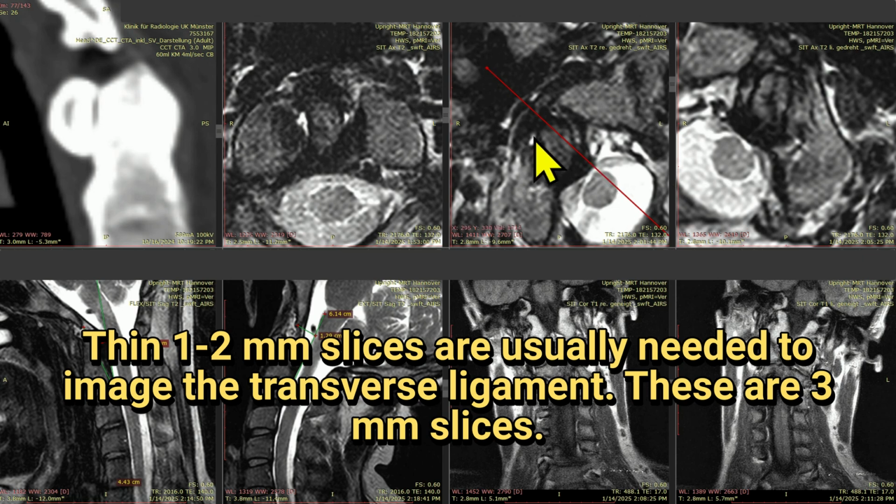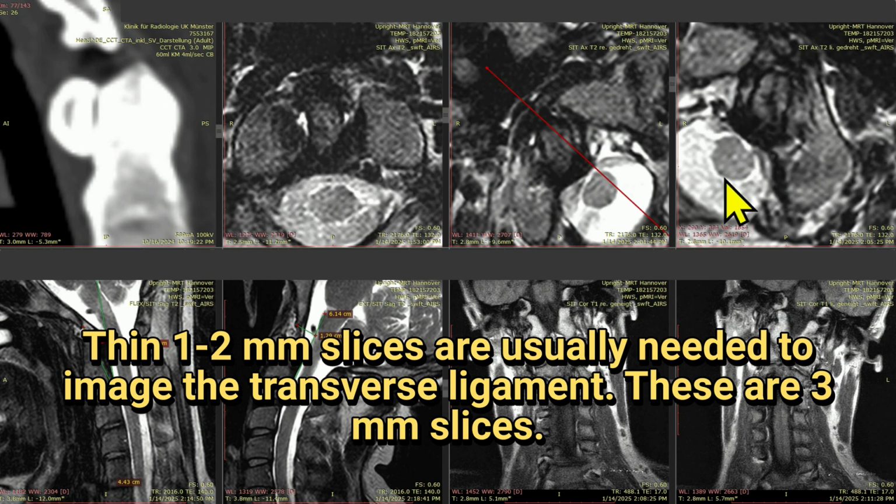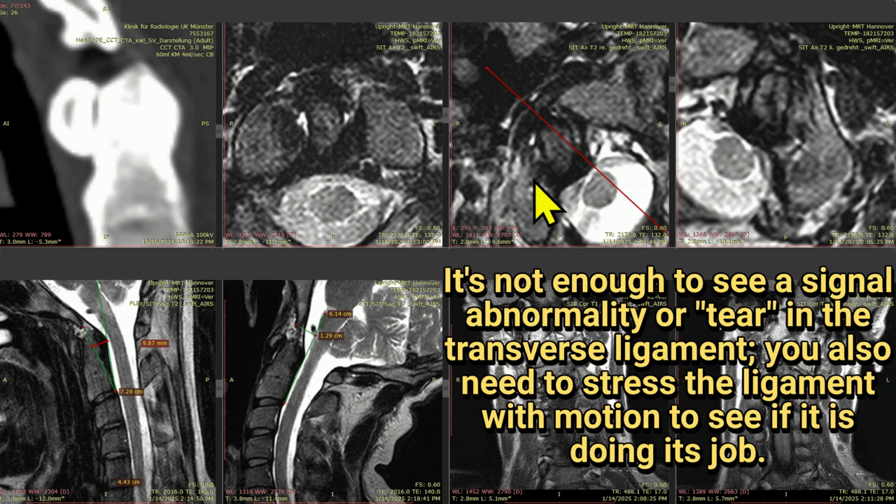On the other side, so this is head turn to the right with head turn to the left. We see some thinning, but the transverse ligament tends to go up. These are thick 3 millimeter slices, so hard to tell. So bottom line is there could be a transverse ligament injury on the left here. And I think this gentleman now needs movement-based imaging.